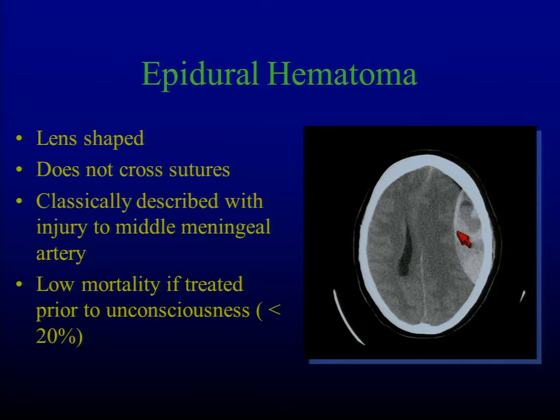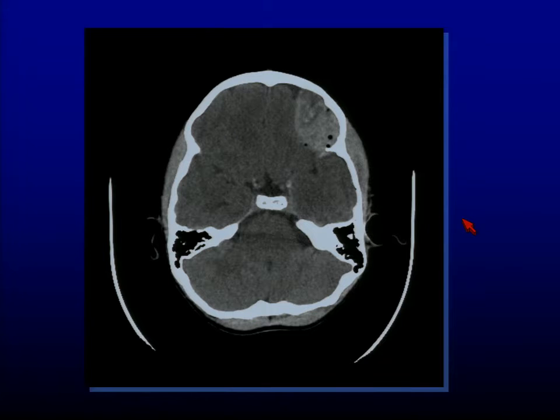So there's blood, it's epidural, and it's effaced this lateral ventricle. There's midline shift associated with it. So there's trouble with this one. But if I can get this out before they are unconscious, they're going to do well.